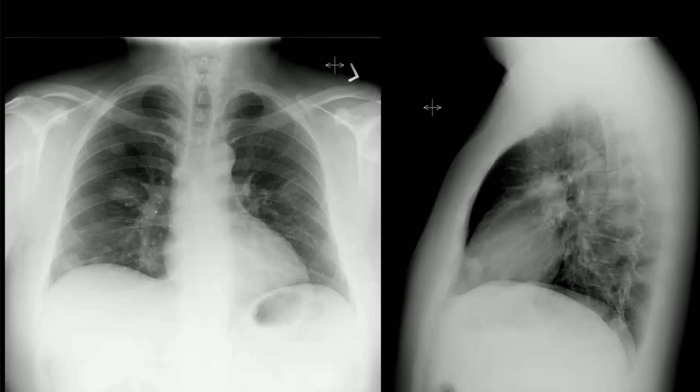I'm provided with the X-ray chest frontal projection and the lateral projection of a skeletally mature subject. There is evidence of multiple soft tissue density opacities in the right lung field. One of them is in the hilar region. Another I can appreciate is near the right CP angle.